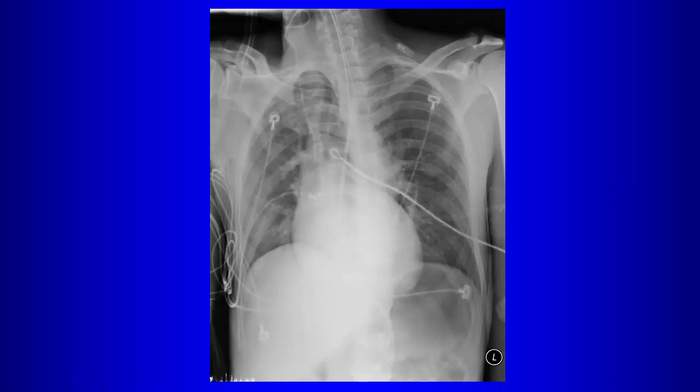Does anybody have any observations? Don't criticize my films. And by the way, this is a great portable chest radiograph, if you've got your chest. So, did anybody have any observations? Anything in first and second years? Okay. Anybody have any observations here?